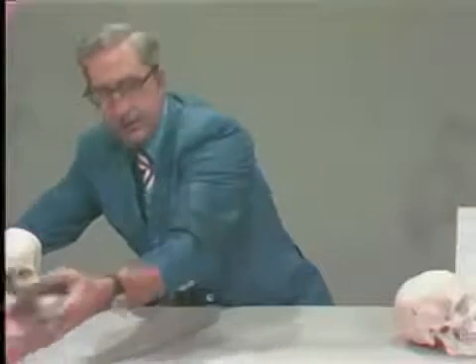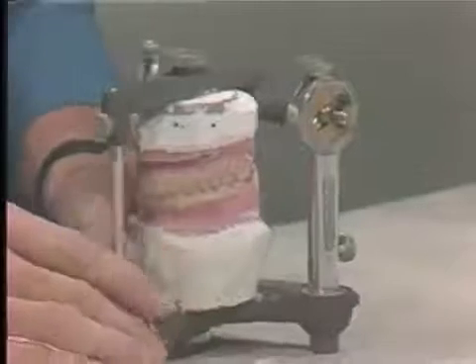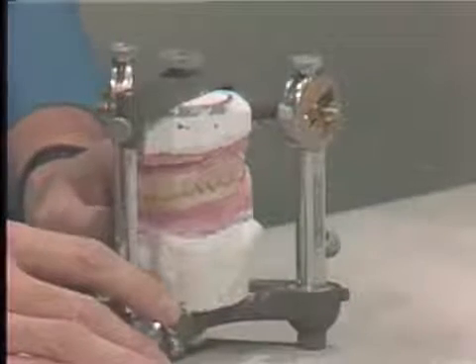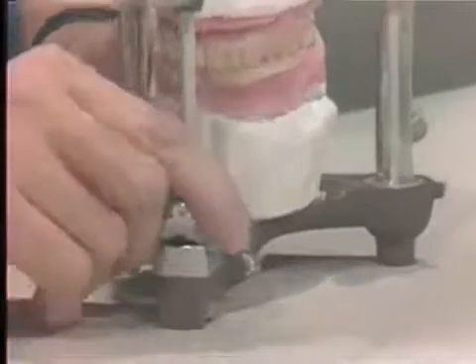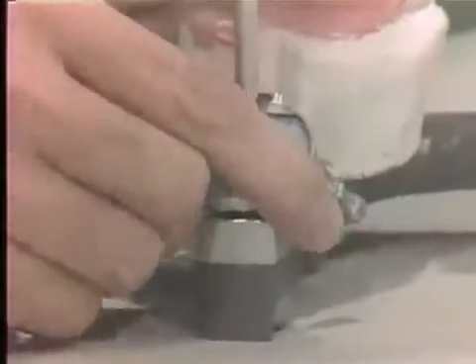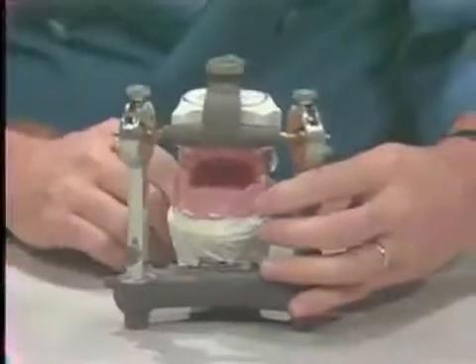Now the next articulator that we would like to go to is one that is referred to as a semi-adjustable articulator, which is the one that you will be using. It's a Hanau articulator. There are several things that we'd like to point out about this articulator. You can adjust the incisal guidance by loosening the screw in the bottom, so you have some adjustment to the incisal guidance and such. You can adjust for Bennett movement.